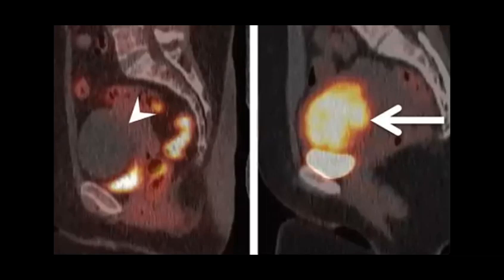Perfect. So that's a good differential, to mention something. Why do you mention something that has fibrous tissue? Why? Because when you go to the uptake, here it doesn't have uptake.